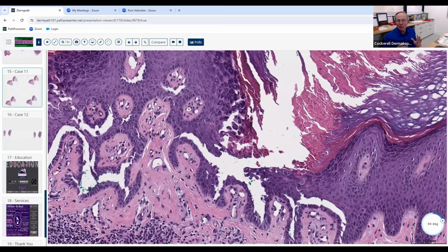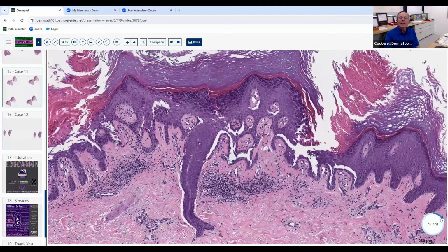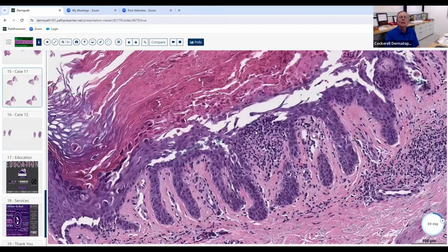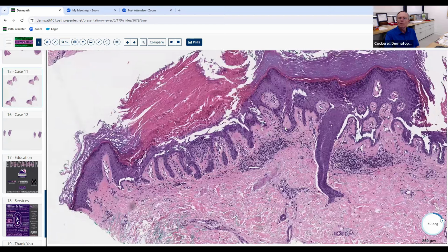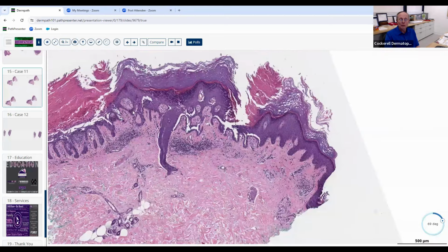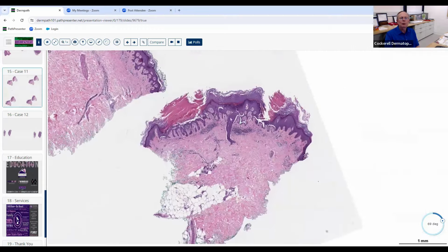Warty dyskeratoma, that's yet another one. Solitary dyskeratotic keratosis. Multiple widespread dyskeratotic keratoses. So there's about 5 or 6 different diseases. Make sure you can recognize this reaction pattern. You're going to see this on the exam also. And this is a nice, beautiful example of the histology. This person happened to have Darier's this time, but you wouldn't really be able to tell that from Grover's necessarily. Usually Grover's is smaller than this. Usually you don't get 2 foci within the same biopsy, but nevertheless, it's a reaction pattern you need to be familiar with.